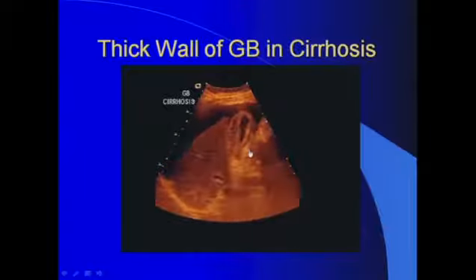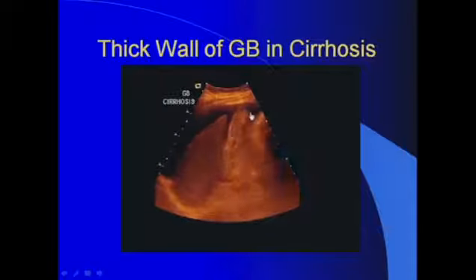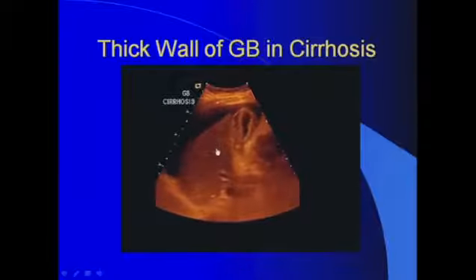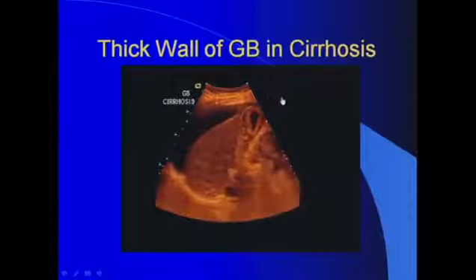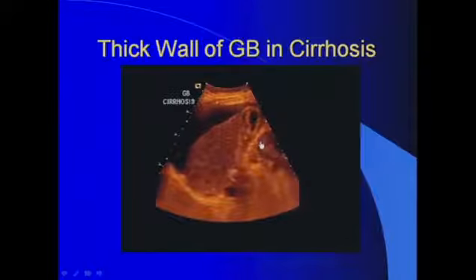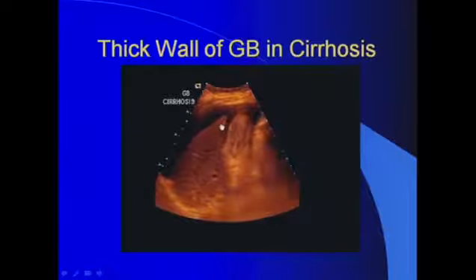In this instance, as part of the differential diagnosis, this thickening is most likely related to hypoproteinemia associated with liver disease. This patient had an albumin level of less than 1.5, so you can tell that this is most likely the cause of this thickening. Now, a teaching point here is ascites does not cause thickening of the gallbladder wall.